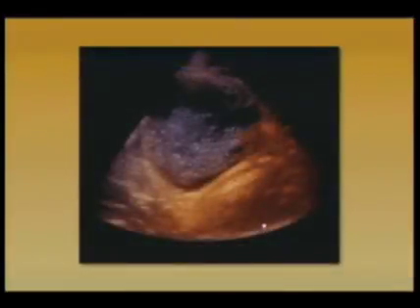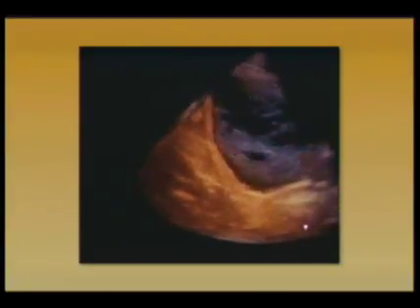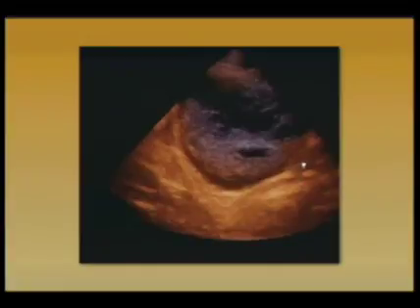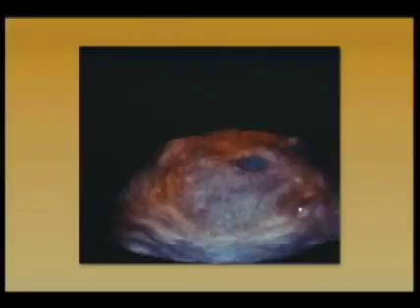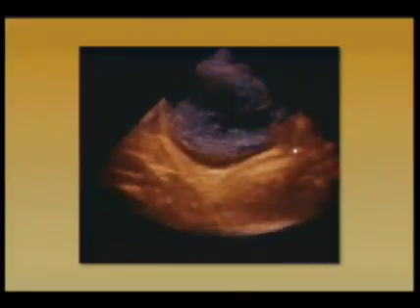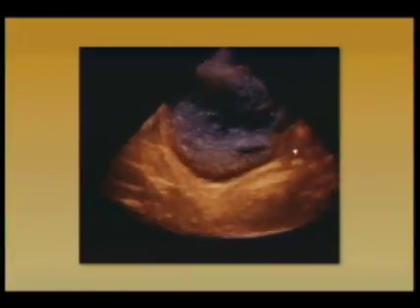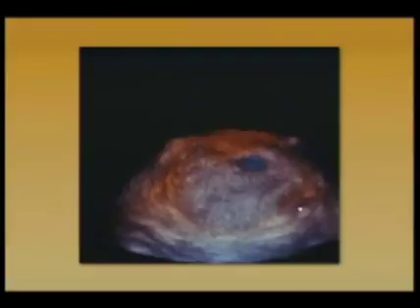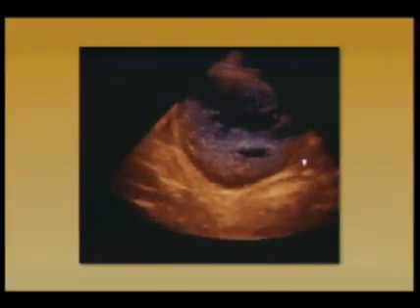Here's another example of a bladder, sort of the opposite of the one that I just showed. As I activate this animation, you'll see a hypoechoic spot, and as I rotate the bladder so we can look down into it, you can see that that actually is the mouth of a bladder diverticulum. And you can actually see through the diverticulum toward its back wall, something that offers a different perspective of pathology that we could certainly see in 2 dimensions, but I think this shows it more clearly.